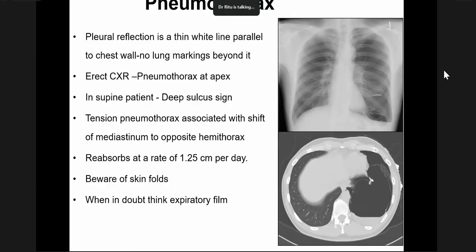In cases of pleural effusion, you also see the pleura because the fluid outlines the pleura or extends into the pleural reflections between the visceral and the parietal pleura, causing pleural thickening or pleural outline, and that is why we see the pleura.